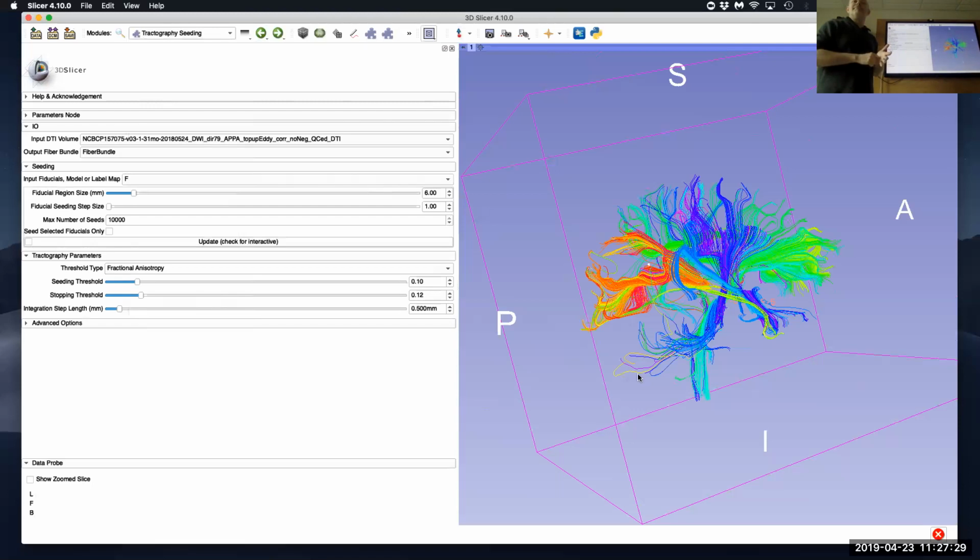But I have not found yet a good substitute, because particularly this one here is something that you want to do when the data comes in. This one here specifically identifies an ongoing problem with the scanner or scanner electronics often. It rarely has to do with motion or anything like that. Motion you would see before getting here. This one here is like, oh, there was no motion, everything is good, but somehow something is bad. And that somehow relates to either the scanner or interaction between the scanner and the individual, such as the Siemens TIM Trio data used to have a vibrational artifact.